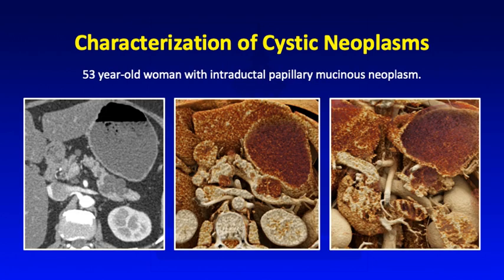And when we look at this other example of a pancreatic cystic mass, in this case is an IPMN, frankly, on the axial images, it can be rather difficult to appreciate the rather thin internal septations. But when we look at the cinematic rendered images with the improved depth perception, we can greatly increase the appreciation of these fine internal septations, leading us to the diagnosis of an IPMN.